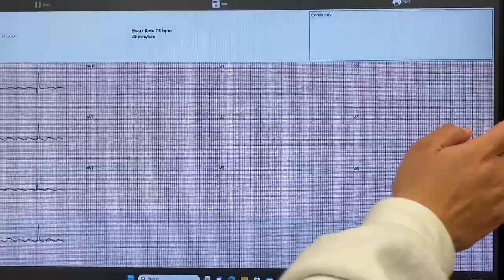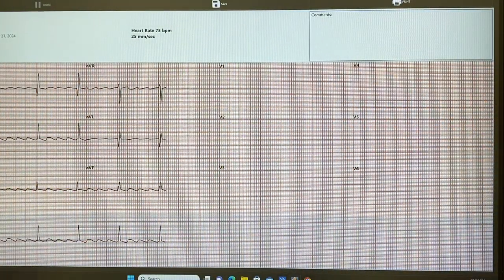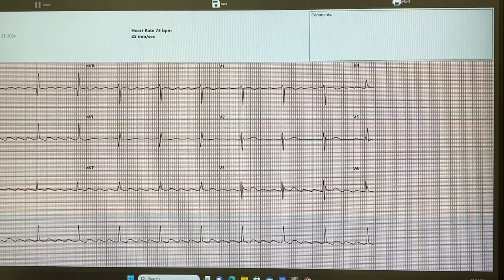That looks beautiful. That's the most perfect thing I've ever seen of this rhythm. Okay, so we're going to look at the rhythm first. So I'll need to map it out. Can I borrow your pen again? Of course. Thank you.